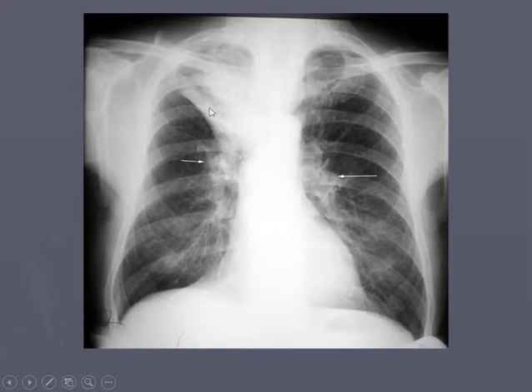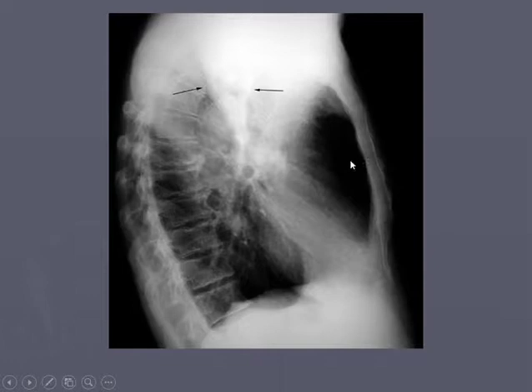So this is all atelectasis up here. It's all squished down. Nature abhors a vacuum, especially in a lung, and the lungs are going to try to fill that space. So with that upper lobe being smushed in a tight little pocket like that, the middle and lower lobes are being stretched to fill that vacuum. And you can see it again on the lateral X-ray. Remember, upper lobes in this area, middle lobe in this area down here, and then lower lobes down here. You can see very clearly this is an upper lobe atelectasis on the lateral view.